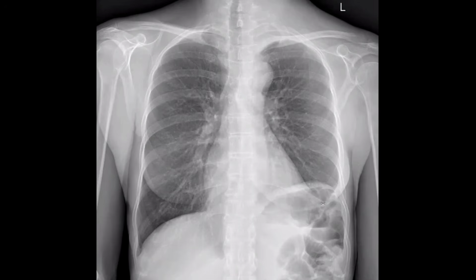Let's concentrate on the lung itself. Do you have something that can explain the elevated copula? Either the copula has traction from the lung by fibrosis, but we don't see any. You started with the lung ABCs, and you told me that we have something abnormal on the right side. What about the left side?